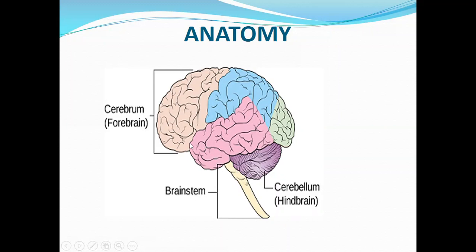This brain, of course, has ridges and grooves. This is why we are able to fit a large brain in a small human skull. These grooves and ridges are very important on scan. You'll be able to see them as white echogenic material, bending or meandering. I'll be able to demonstrate more on the coming slides.